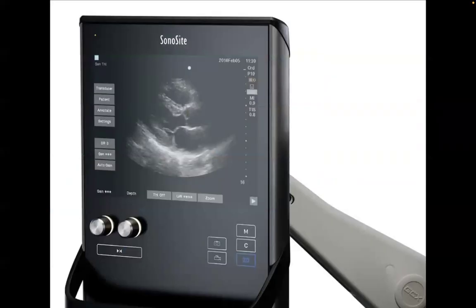Now, every ultrasound machine is a little different and it can get kind of intimidating when there are so many buttons, but just really know about these few buttons for now. One is the transducer button. This allows you to choose the transducer and the actual scanning mode. For the Butterfly, we can review that, but basically you can change to the abdomen preset or the vascular preset or the lung preset. That's what that button is for.